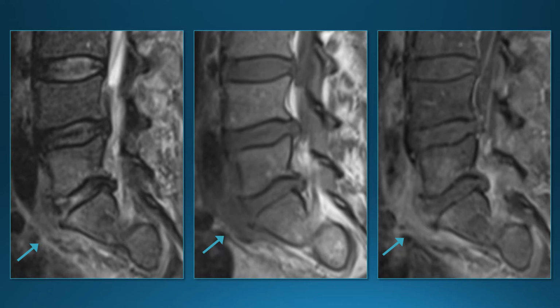Now there's a little bit of indistinct end plates over here. It's pretty subtle. Again, some T2 bright signal in the disc. But the most important finding that we missed was this prevertebral soft tissue thickening and enhancement, which if we had seen earlier on, we might have suggested that the patient could have discitis, osteomyelitis there, and that's what initially actually brought him into the doctor, because his actual main complaint was the low back pain.